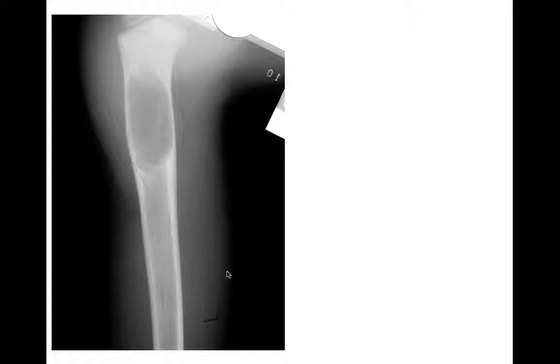Next up, radiograph of the proximal femur, again in a child. We have a geographic lytic lesion, narrow zone of transition. Is there a sclerotic border or not? If you want to say this is slightly sclerotic up here, not down here, I'm just going to call this a non-sclerotic border. There is no periosteal reaction around this. If you want to say this sclerotic density right here is a fallen fragment sign, that's fine. In this case, that would make it another unicameral bone cyst.